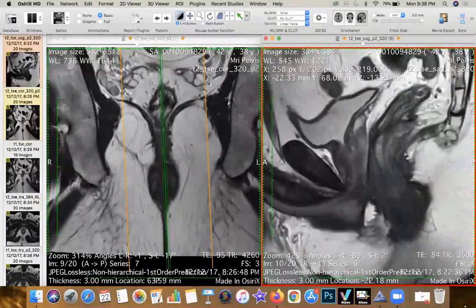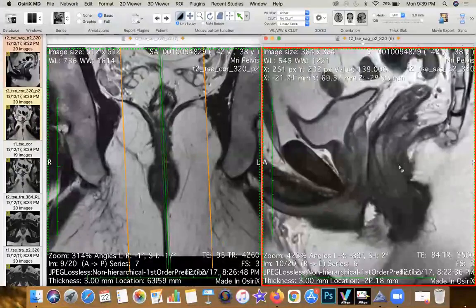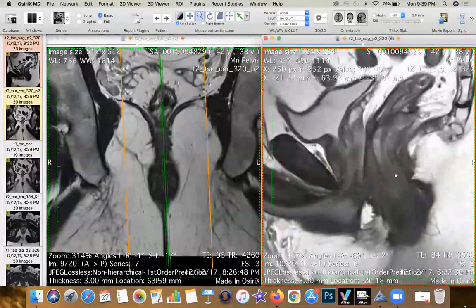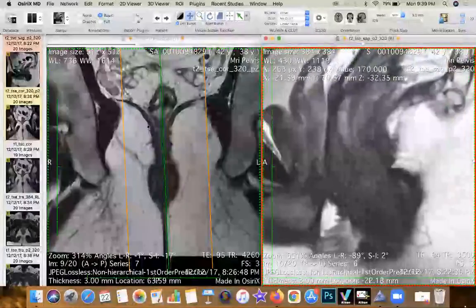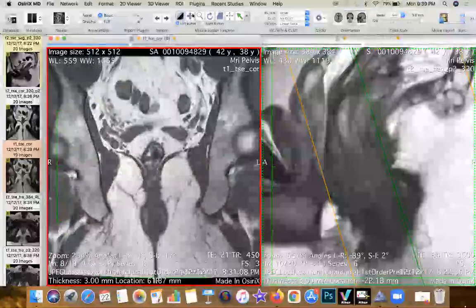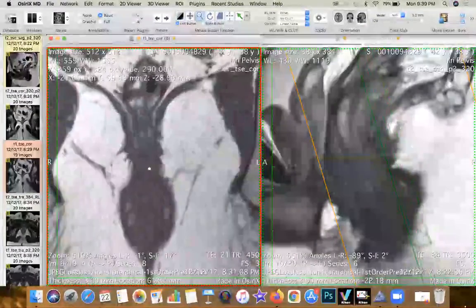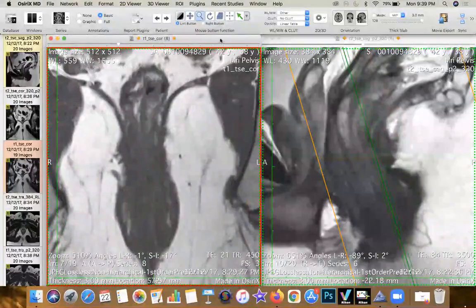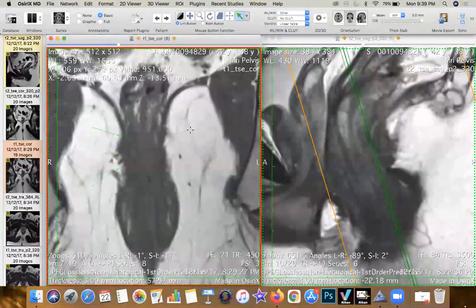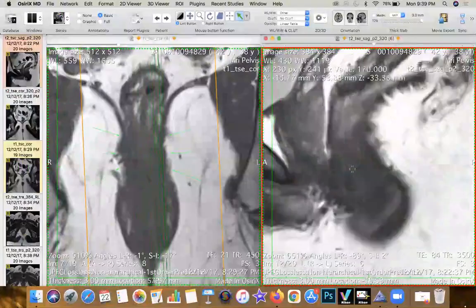It's not a complete circle. It hooks along the posterior edge of the rectum, and it forms a condensation along the posterior margin. So I'll show it to you on the sagittal. Here, I've magnified the image pretty well. I'll put the T1 coronal out here for you all to appreciate the muscle very clearly. So I'm going to go back. You see this muscle group here, which I've annotated. That is the puborectalis. I'm going to move first off center to the sagittal aspect.